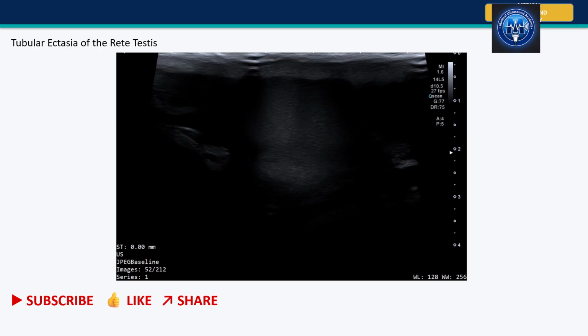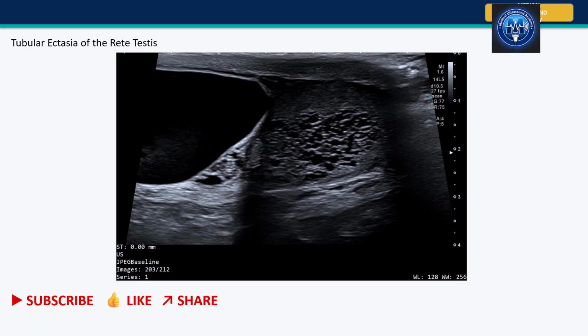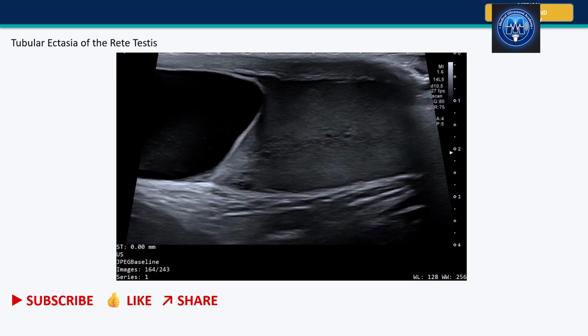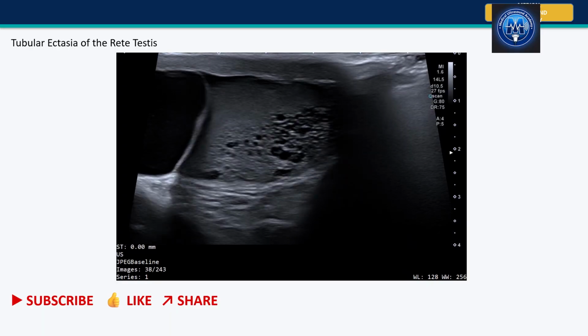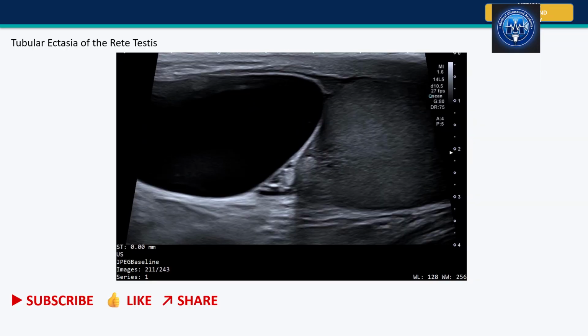So we have the case here. This is what we have. Have you ever seen this before? So we have got a hydrocele here, but this hydrocele is only encysted in the inguinal canal. There you can see that. So this is what is called an encysted hydrocele.